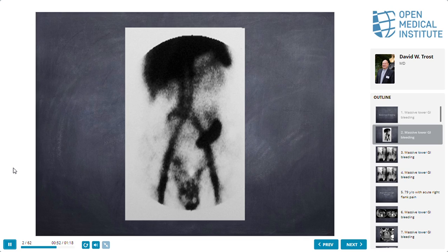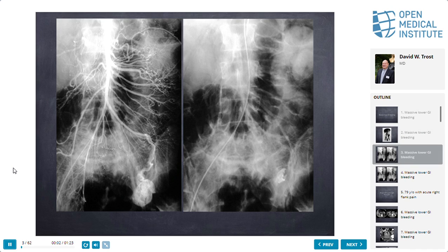Also, this is the aortic bifurcation right here. Kidneys are right here. There's the kidney. No, it's this. That's how much they're bleeding. It's that much. And so they went to an angiogram, and we saw this. So this is an early image, and this is a late image. So what do you think this is and what's happening?